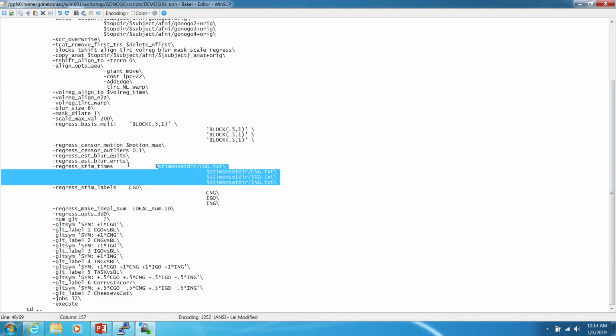But that's much harder to read and understand, and the ePrime file doesn't work in TRs. So it's easier to use this command. And this just reads in all of those events that happened in time for each of the 4 runs and says, okay, this is our regressor. So this one has 4 regressors.